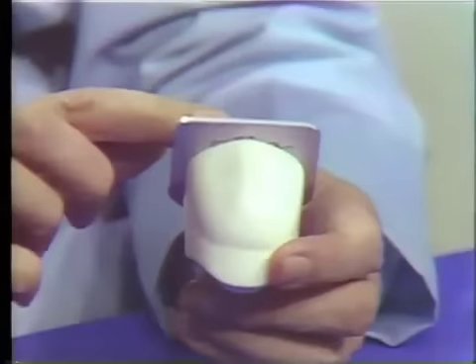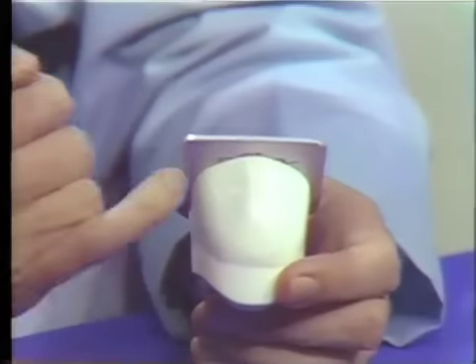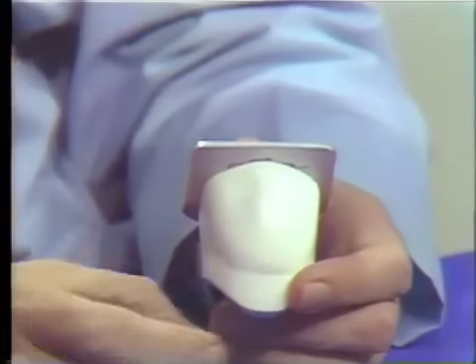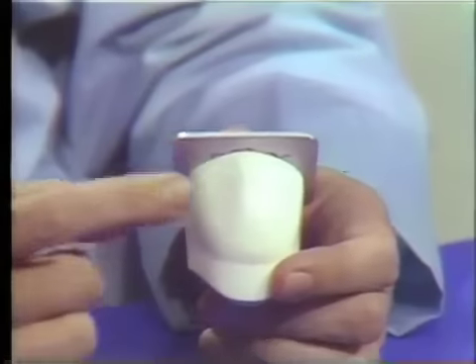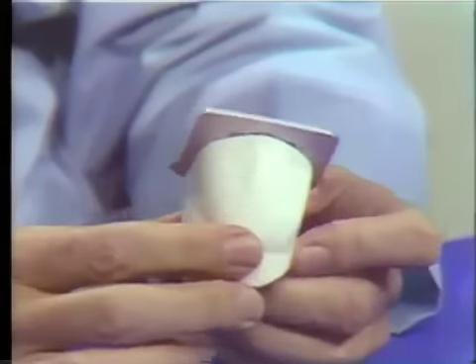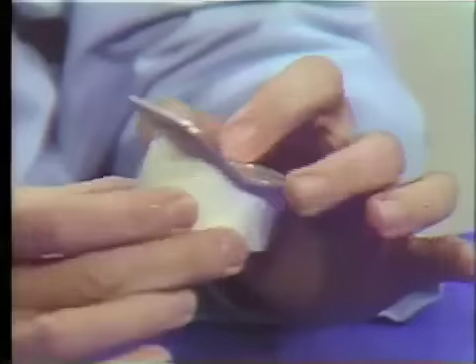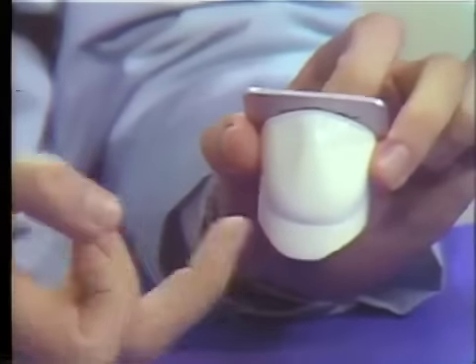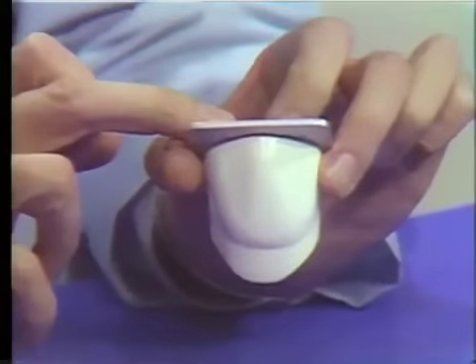The boundary between gold and tooth substance here, of course, is predetermined, so that it cannot be modified in any way, such as you could do with a long pin facing. So this determines the relationship between the gold protection and the facing here. This is for a bicuspid. Similar ones are used for the molar teeth. It has the advantage, you see, of placing porcelain against the fitting surface and against the axial surfaces, gold being only on the occlusal surface.